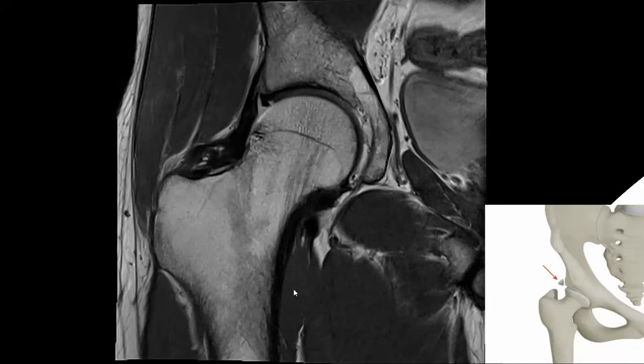The hip joint itself is a ball and socket joint composed of the femoral head articulating with the acetabulum. Now the acetabulum is actually the junction of the three bones of the pelvis, the ilium, the ischium and the pubis. It is important that we evaluate all of these bones and the sacrum in routine hip MRI imaging, because fractures of any one of these bones can present as vague hip pain. The acetabulum approximates the surface of two-thirds of a sphere, which is incomplete at the inferior aspect where the transverse acetabular ligament crosses.